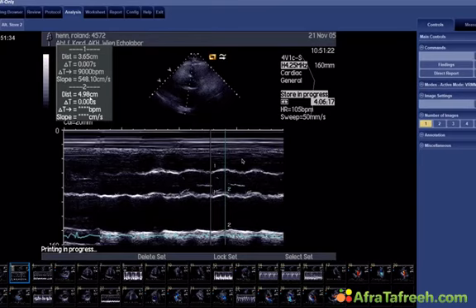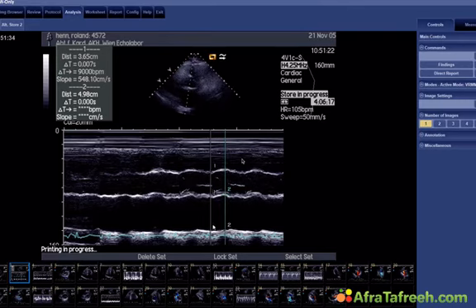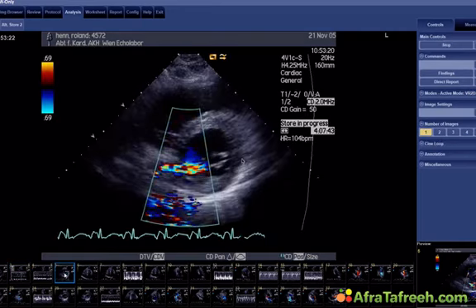Measuring the size of the aortic root and the left atrium again shows you that in the M mode, 50 millimeters is certainly dilated. Now I'm showing this even though I'm pretty sure that this is a measurement that you will probably not need to do anymore. I think the M mode of the aorta and the left atrium is something that is more of the past, something that we've done at the times of M mode. And nowadays, the better way of quantifying left atrial size is by measuring the diameter and even more so the volumes. We'll do that later just to give you a feeling of how these measurements that I show you here compare with the 2D measurements.